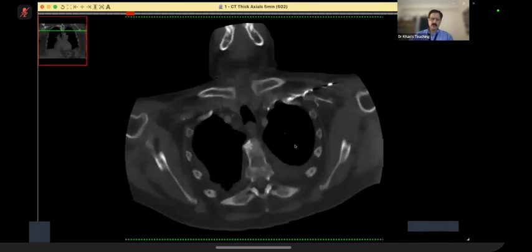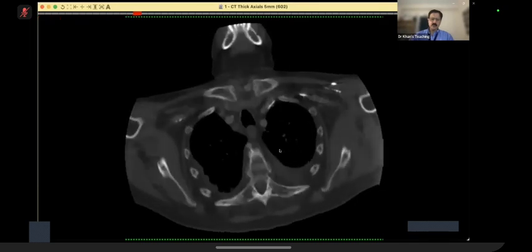Okay, just one second, please. I'm moving the mouse myself, so don't move the mouse. Okay. Now, what do you think?